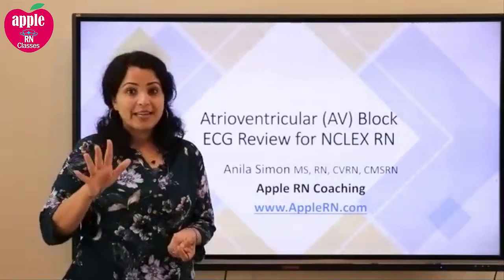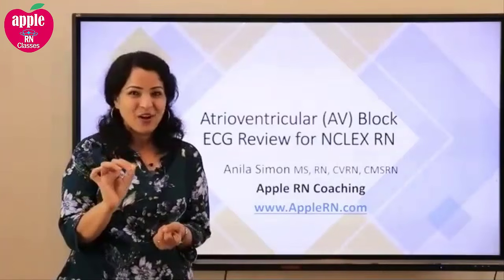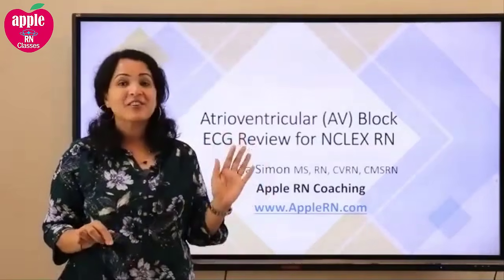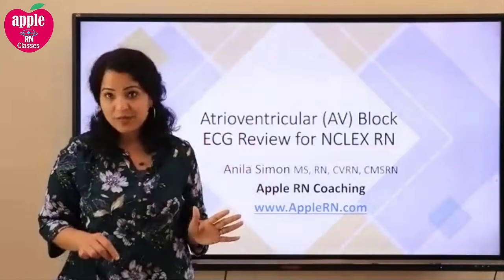I just wanted to do this one specifically, atrioventricular block, AV block. Even if you don't know anything about it, you're going to be happy that you attended this session, because by the end of it, you will be able to interpret it.